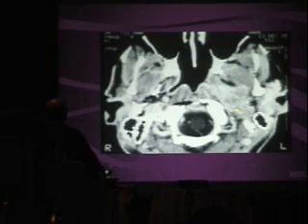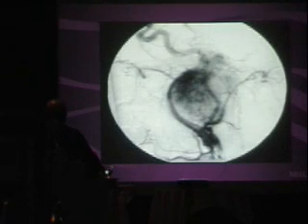On the other hand, here's a different looking lesion that you have to go up and down to see. It's not projecting well, but this lesion is actually splaying the external and internal carotid. And it has more of an irregular, patchy, flow voids, salt and pepper type appearance. What is that more likely to be? Glomus tumor, carotid body tumor, splaying the internal and external.